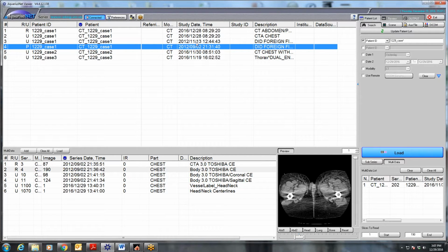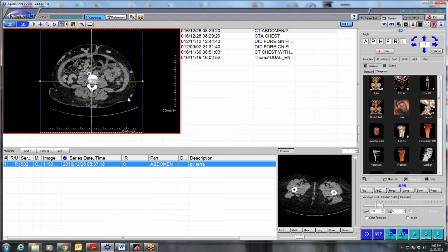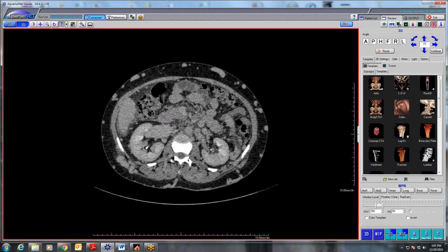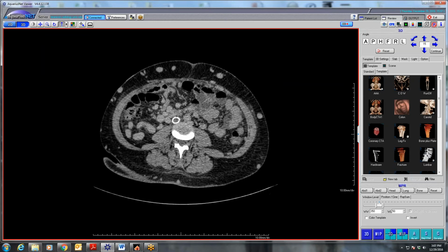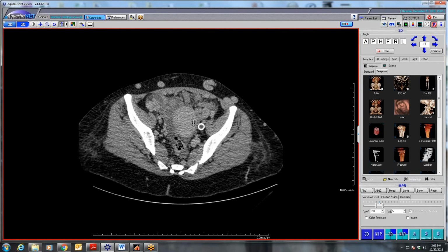Before, she had some venous flow into her IVC to drain her hepatic and renal veins, which then went through collaterals. Those are now pretty much completely thrombosed. The IVC at least held some contrast before, or whatever was remnant of the IVC lower down, and that is completely thrombosed.